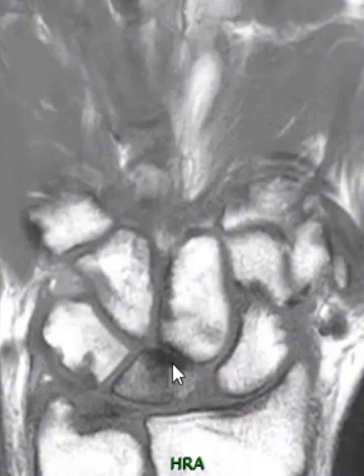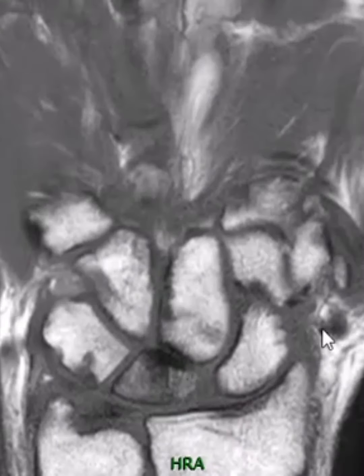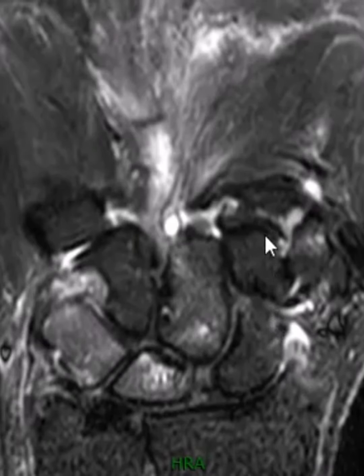So the capitate bone and the lunate bone over here have some darkness, which is reactive bone sclerosis, and throughout the lunate bone there are also a few little bone erosions scattered around, and a little joint space narrowing. I believe they have an abnormal proximal wrist, and then there's abnormal stress between the capitate and the lunate, and there may be an etiology for that even there.